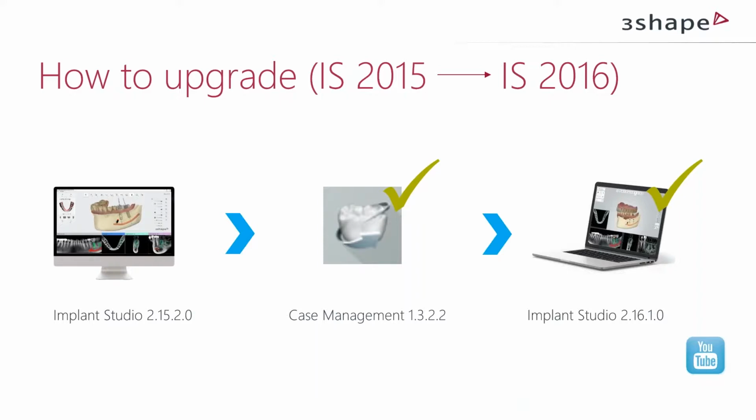All right, so now let's talk about how to upgrade from the existing version of Implant Studio 2015 to the latest 2016 version. Because if you are our user, then you don't need to install it from scratch as a new user, right? So it's easier to upgrade from the existing version of Implant Studio. So existing Implant Studio users will be able to upgrade to the newer version in Implant Studio 2015.